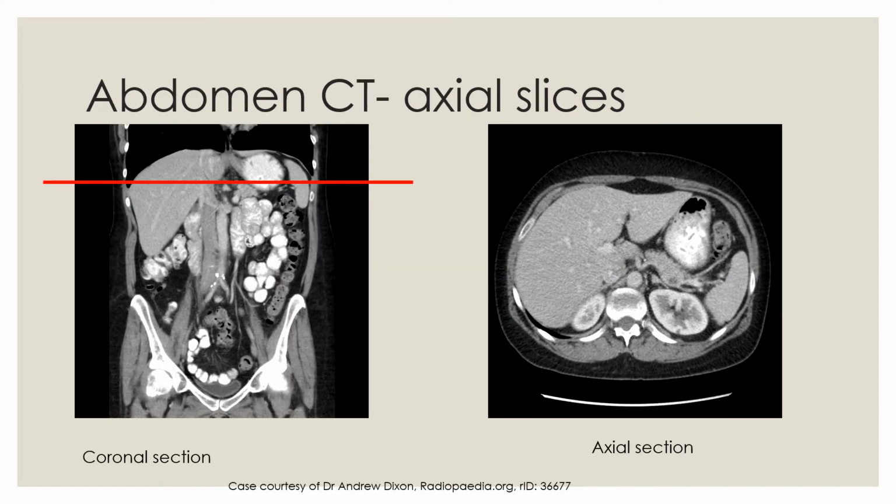So, if you remember, I talked about thinking about looking at the patient as if they were at the end of the bed. So imagine we're looking at the plantar aspect of the feet here, and they have gone into the scan like this. So we're looking like that. And so laterality is very important here. So the opposites are true. So right is on the left side of the screen and left is on the right side of the screen.